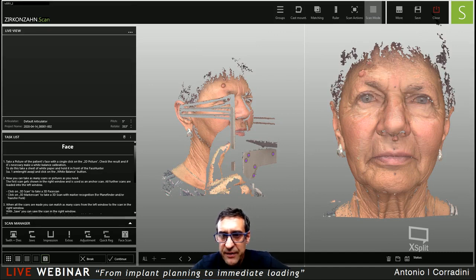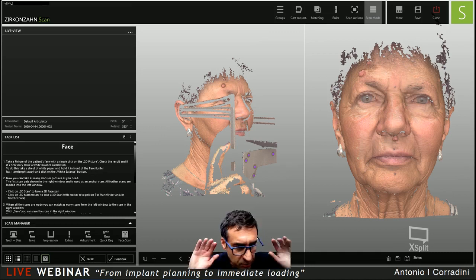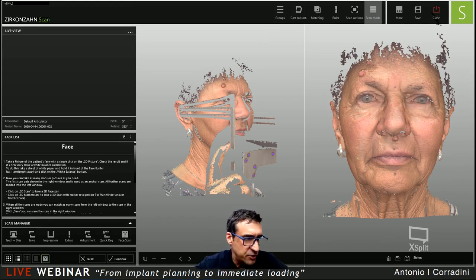So here on the right side, you can see that we have already one three-dimensional patient with 3 scans. If you want to have more than this area here around the hair, you also have the possibility to make 2 more. So you can match together 5 scans to have one complete reference scan. This that we see on the right is my reference scan.